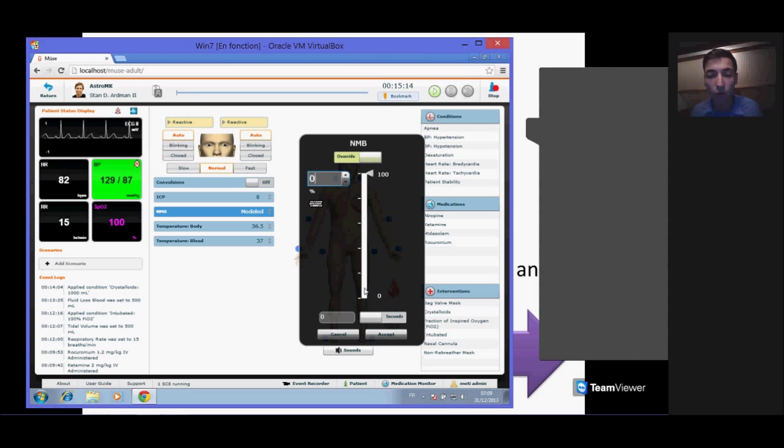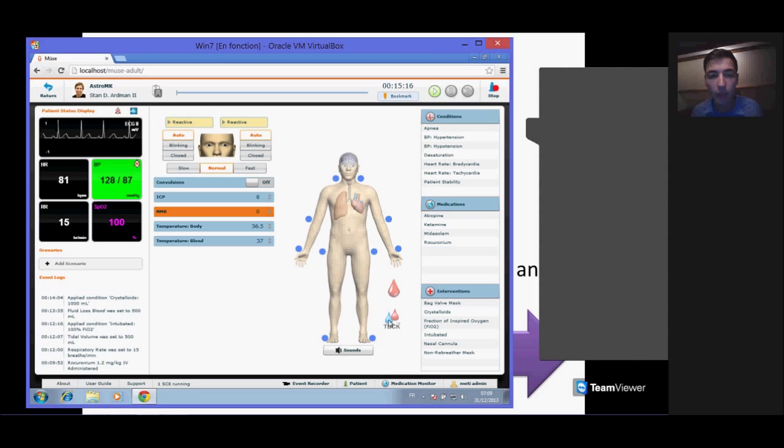So if we put it back to 0, ventilation is going to resume, and basically the patient is ready to be extubated. That's obviously something you need to check before removing the tube, that the patient is breathing and conscious. So this is what I recommend doing at the end of the surgical procedure to reverse the muscular blockade.